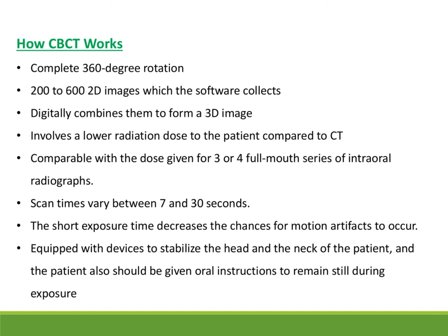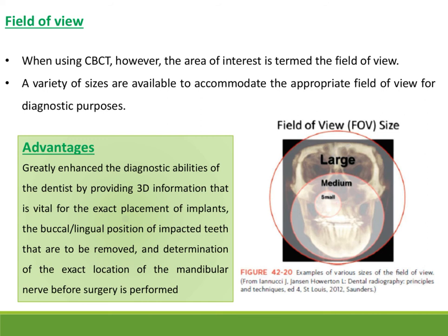So here, FH plane, very important. If the FH plane is not considered and not positioned correctly, you can get the cut in the mandible. You also have different options to take different sizes of the facial bones. For example, you can take a small size region, a medium sized region, or a large sized region.